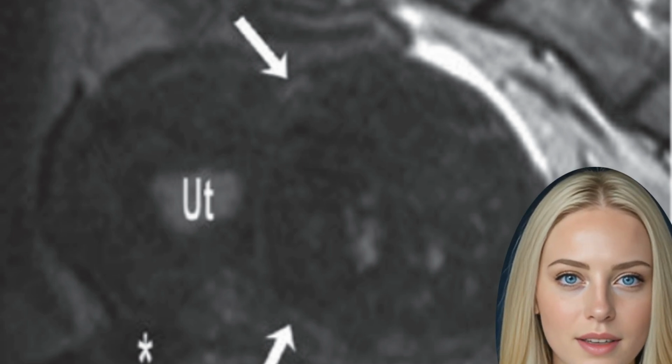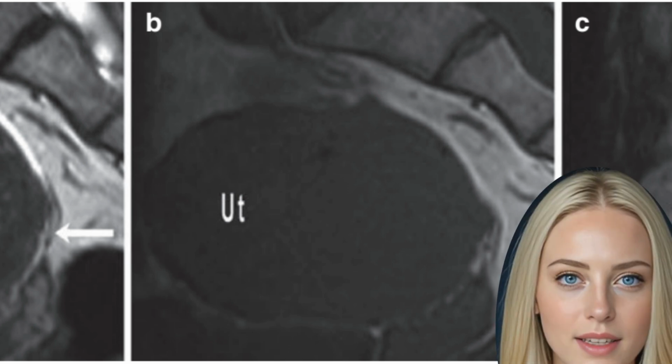Endometrial implants are hypointense in native T1WI and T2WI images. Sometimes T1WI hyperintense spots may be present in between the implant if endometriosis is implanted. In the abdominal wall, detection is made with a T1WI sequence with fat saturation.